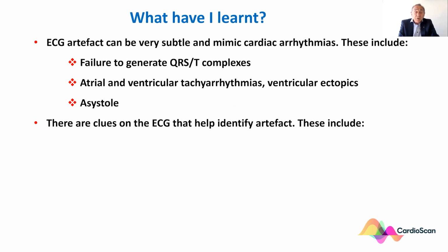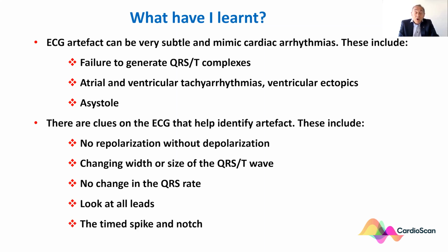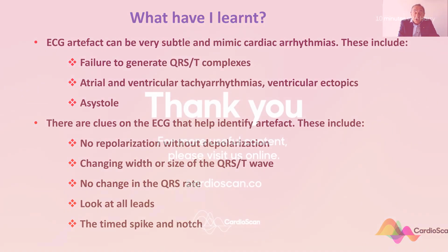These include no repolarization without depolarization, changing width or size of the QRS and T waves. There is no change in the QRS rate, and you have to look at all leads. Remember also the timed spike and the subtle notch.